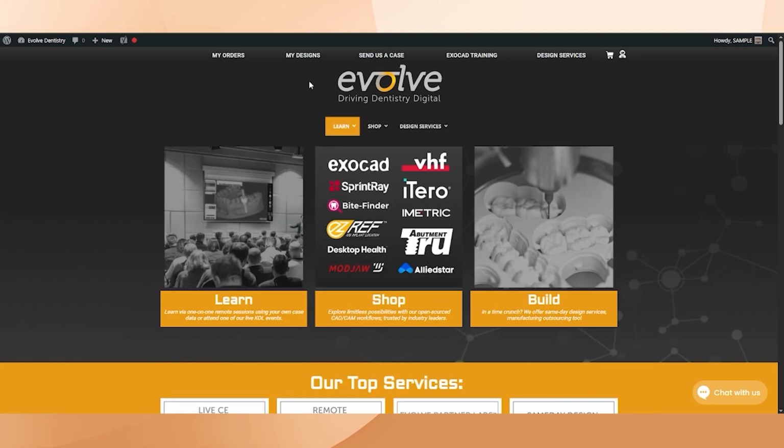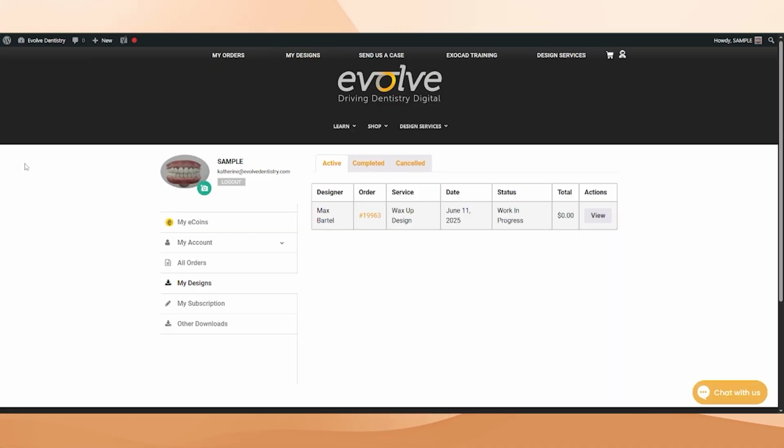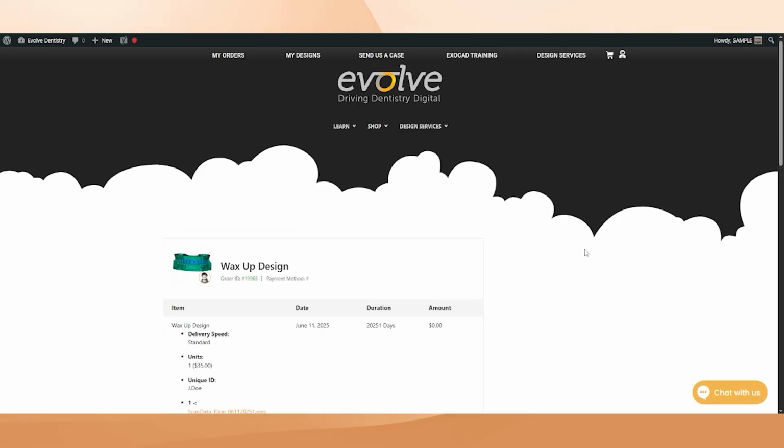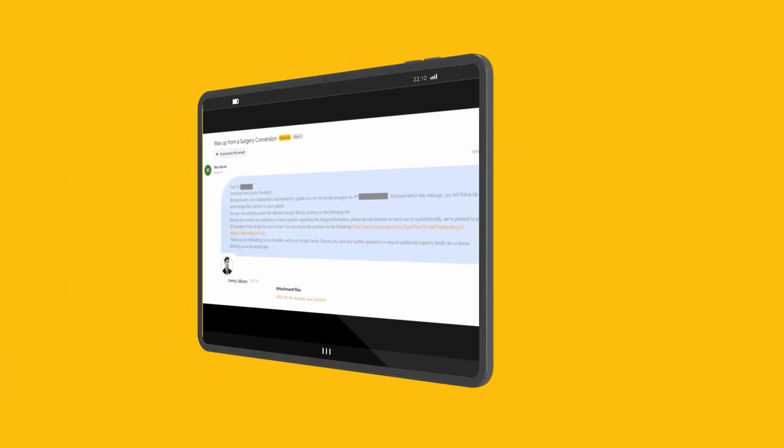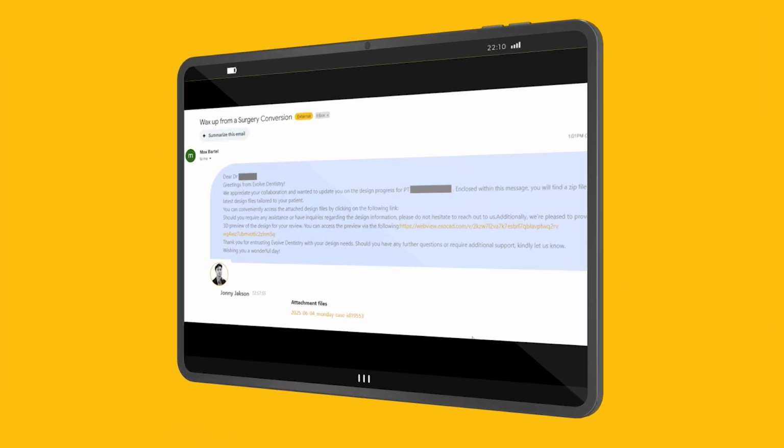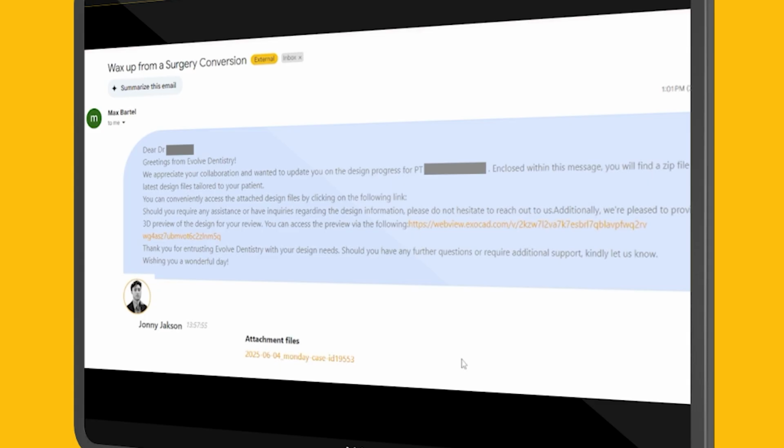To check on your designs, go to the My Designs tab at the top of the site next to My Orders. There you will be able to chat one-on-one with your designer, review your file, and download the final design once it's ready. You will also get an email when the design is complete. Click the link at the bottom of the email or refer to your My Designs page to review the design.